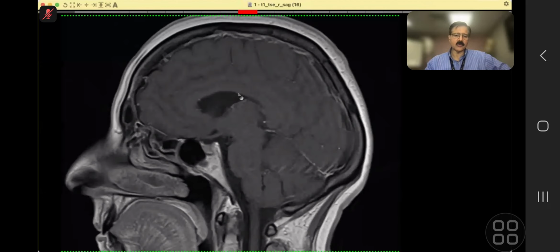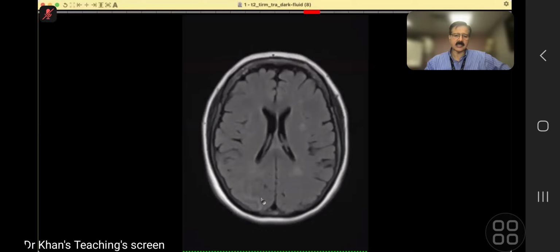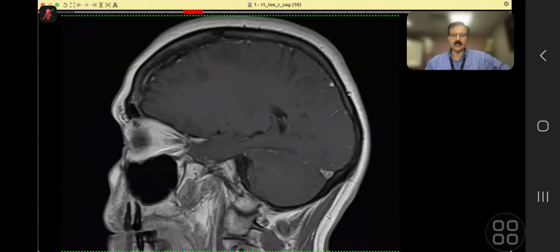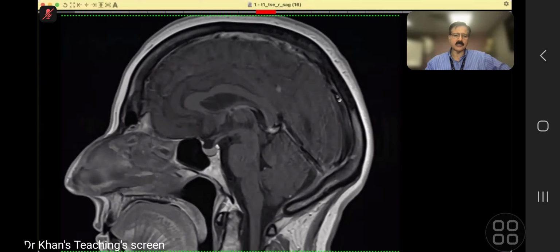We recall the patient for the full study, because in TIA we just do limited sequences. And on this axial FLAIR, once again, this of course can come in the exam, as I showed you. Sulci are high, and look at this versus this. And on post contrast, there were some artifacts, but I believe the most convincing one is the sagittal finding. And this finding should be etched in your brain, how leptomeningeal enhancement looks. And then comes the differential.